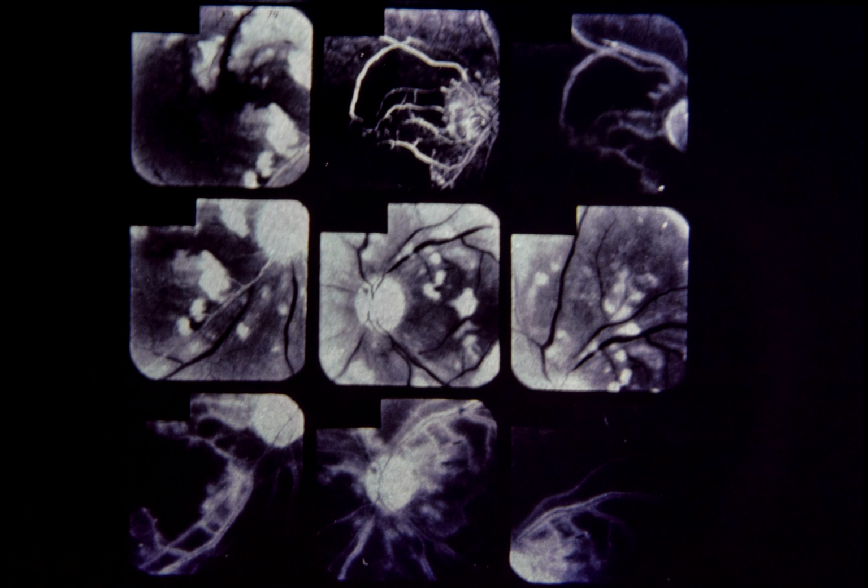Lower left, hypoxic damage to the vascular endothelium in same area results in staining of vessel walls and dye leakage into retina. Directly center, in photograph of left disc taken in red-free light, and lower center, in fluorescein angiogram of left disc, note dye staining of vessel walls. Note similar findings center right in superotemporal region of left eye and lower right in fluorescein angiogram of same region.